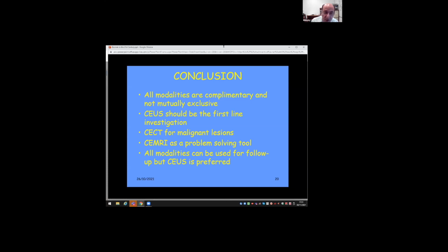Anyway, we couldn't resolve this issue, so this patient is going to continue with CT. Next case. This is another case where CT suggested another CT to reevaluate a renal cyst. Ridiculous. Finally, we agreed we'd do an ultrasound. It turned out to be a simple cyst. So the initial decision for CT to suggest another CT, I think, was wrong.